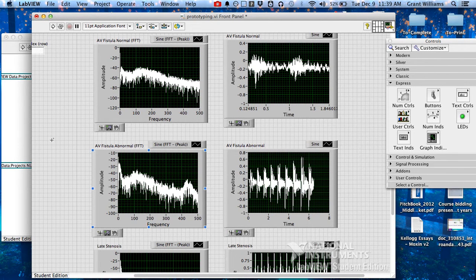So this is just something to prove rapidly that we can do a frequency domain analysis on captured audio files. What we need to do next is find either in published papers what frequencies may signal abnormality and kind of hone in on that region.